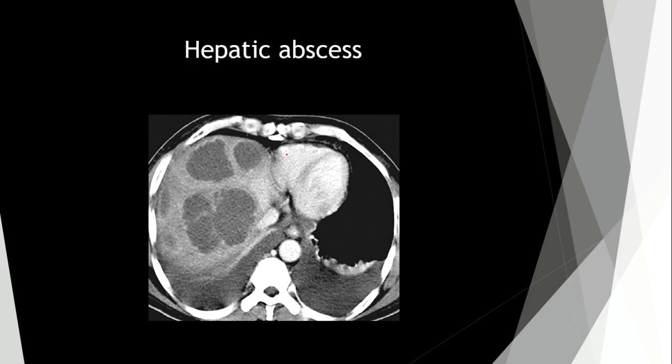If we use a special application to look at the CT scan, we can choose every part of the CT and understand what the density of this part is. And if we take this density, we must look at what the density of the structure is.